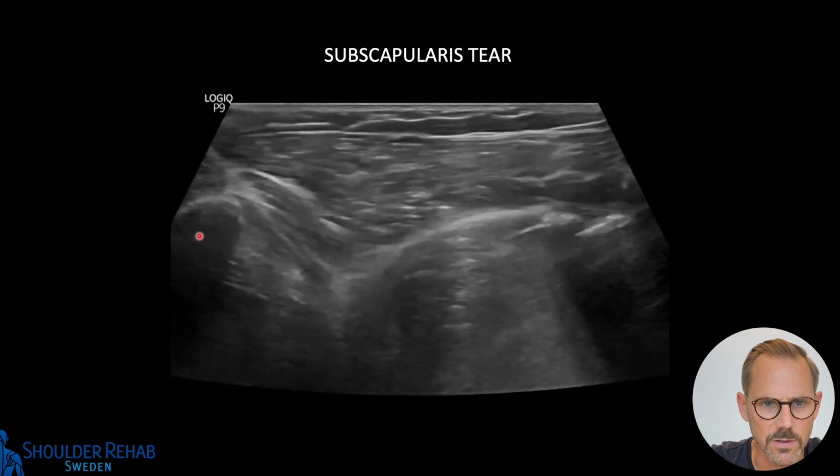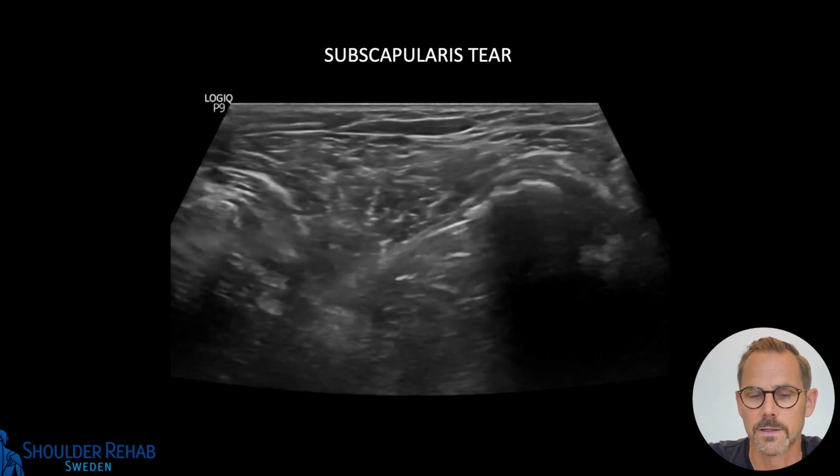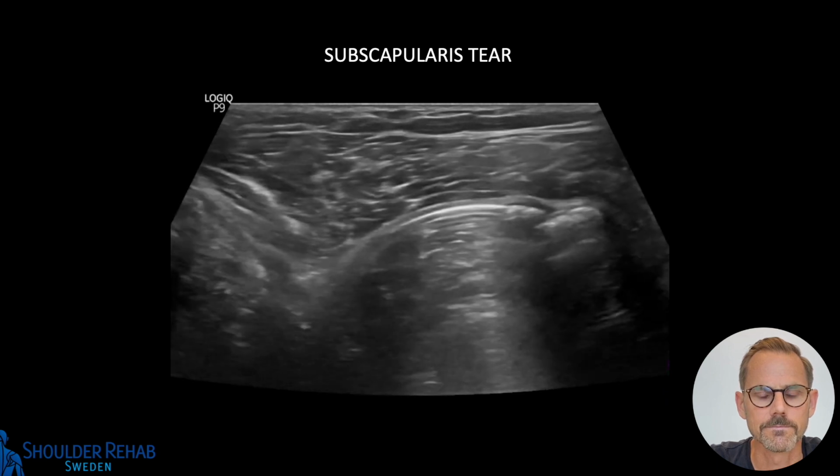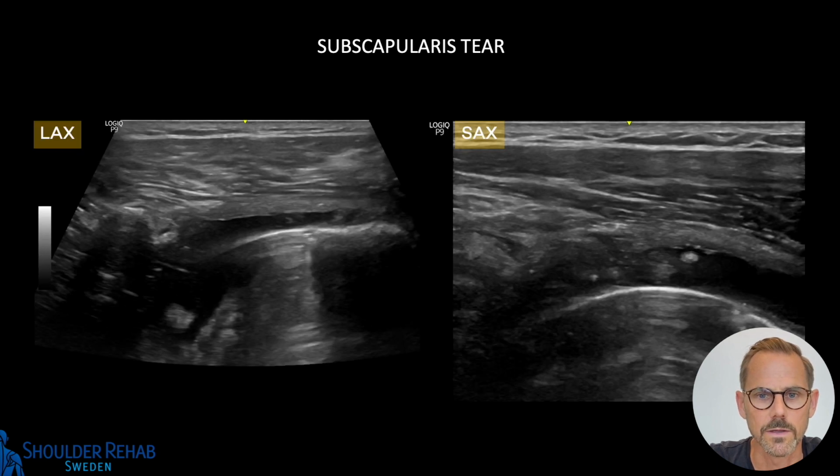So that's the coracoid process. Another example of this, we have the long axis view, coracoid process. We have a black void where we usually see the subscap, so prosthetic head, black fluid-filled void, and this is the short axis view, proximal, distal, and prosthetic head, black void.